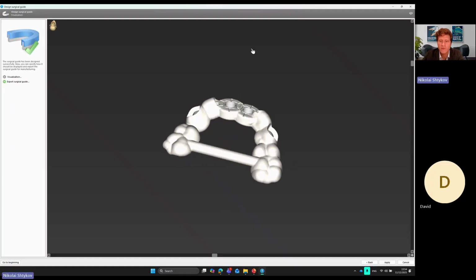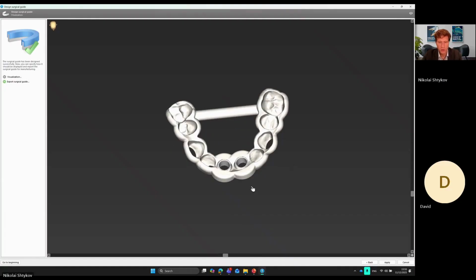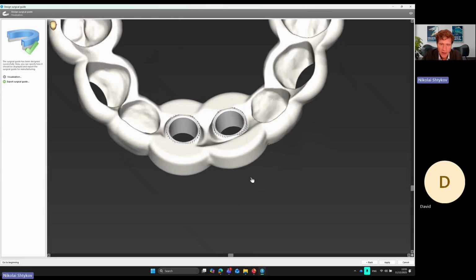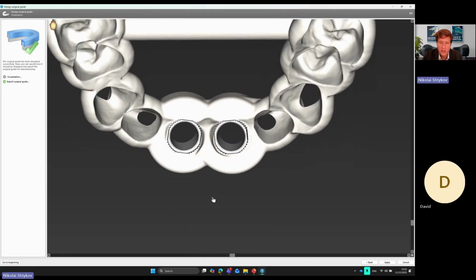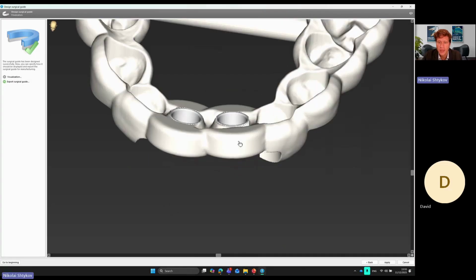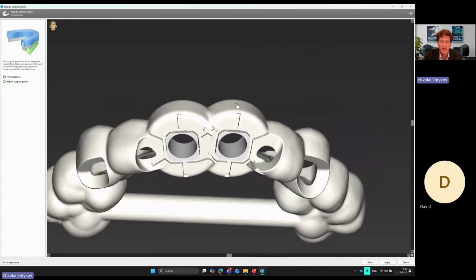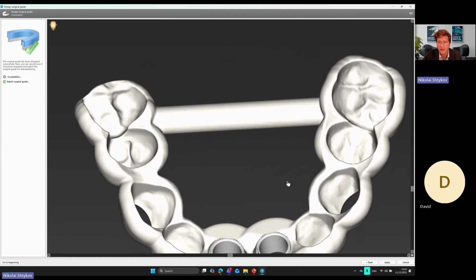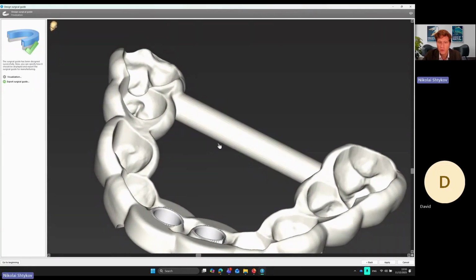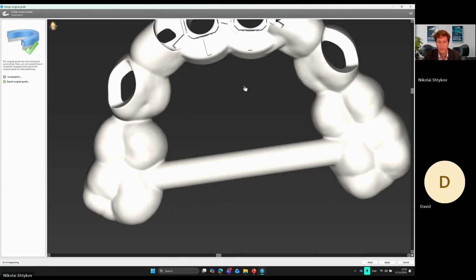Now you can see preview of your guide design. You can see the sleeves here, and this area avoids the gum of the extraction, because this is like interference with the plastic, with the gum here, with the model scan. All undercuts you see have been blocked automatically because you selected the insertion view in the first step, and by the insertion view all undercuts will be blocked out.